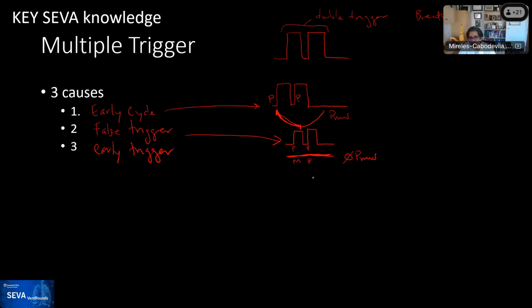And there's multiple reasons for that. It can be from reverberation in the line, in the circuit, the algorithm for control as we see on some Servos, and heartbeat oscillations, whatnot.